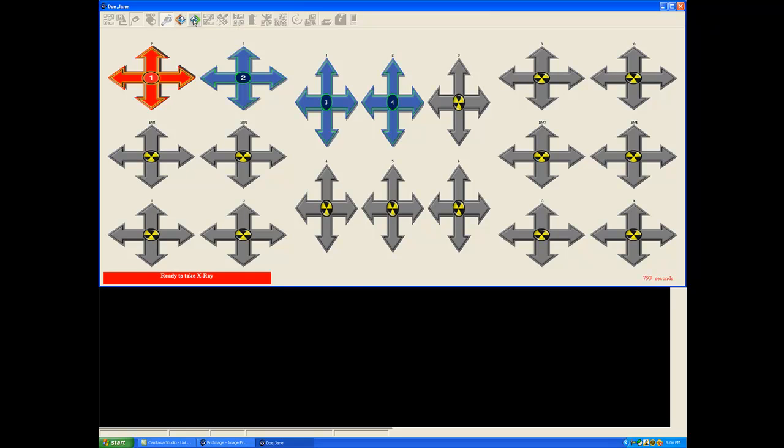So if I hit this button, notice I'm jumping ahead in the sequence, and by hitting or clicking on this button, we're backing up in the sequence. And by hitting the Start Stop, I finish with this mode.